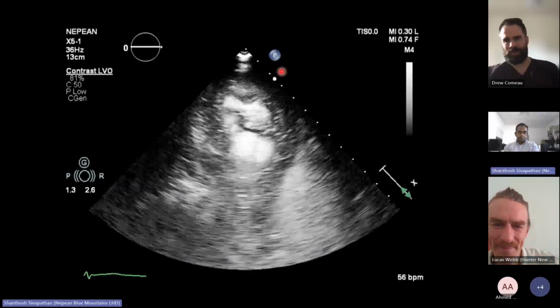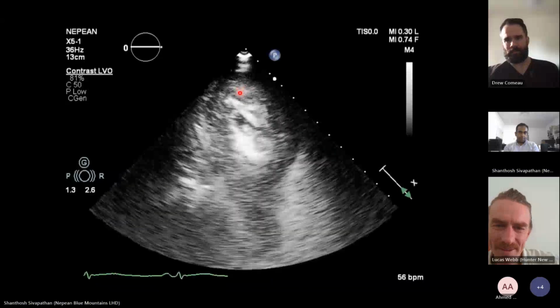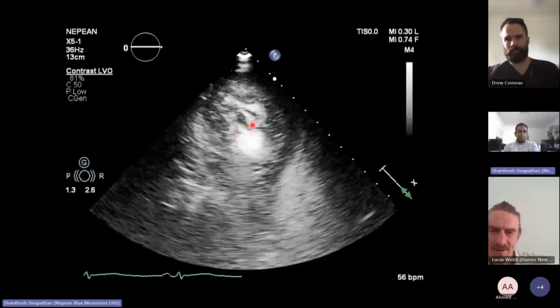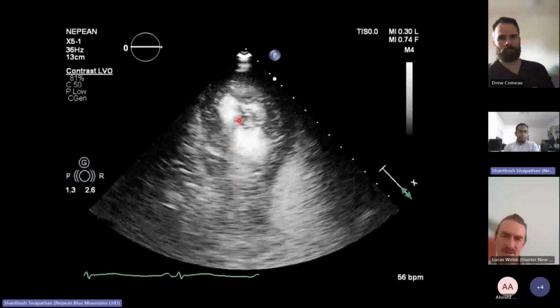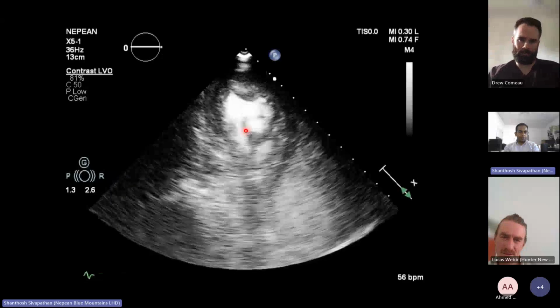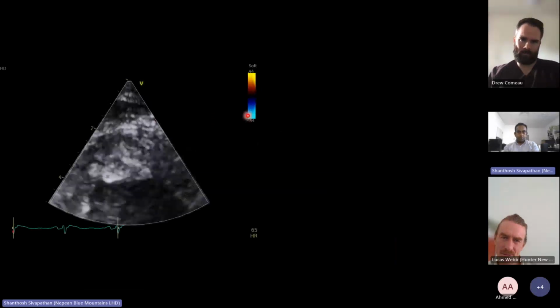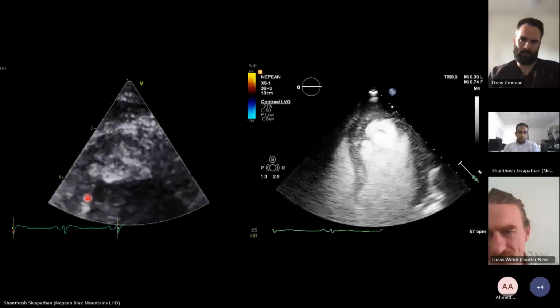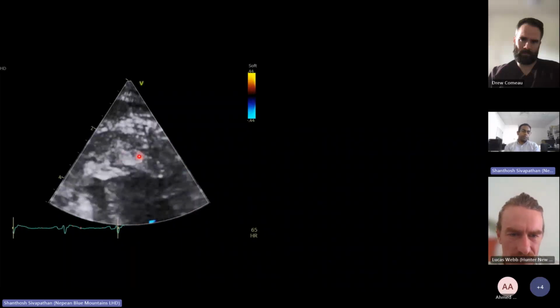Yeah. So can you guys see that, where my laser pointer is, or that red marker there? That's your clot there. Remember when you guys looked at SEC and that slow flow? Here you can see much more easily how slow the flow is. So let me see whether going back, see if I can go there. This is all thrombus.